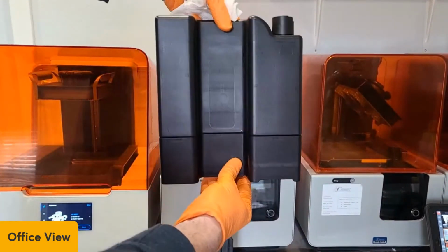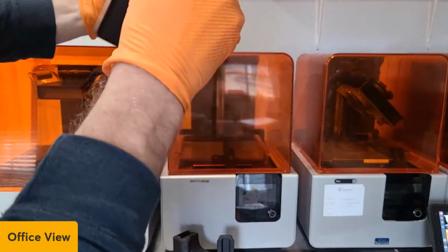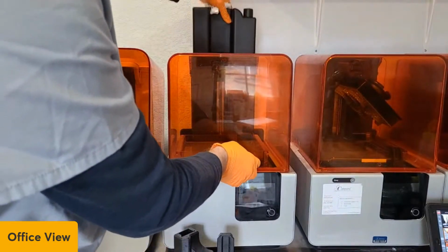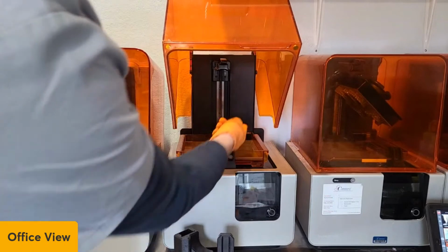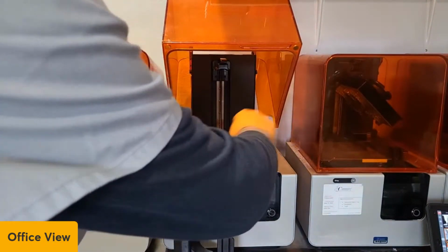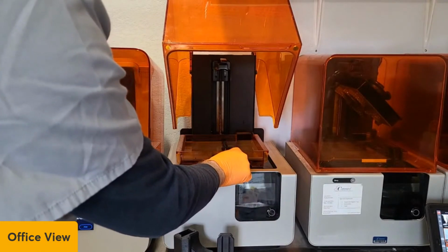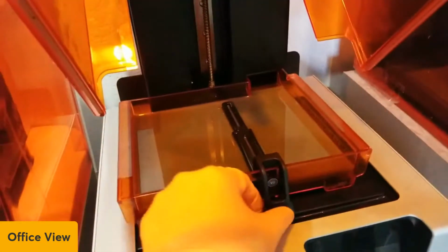So these are my draft resin cartridges, and they auto dispense. It has a sensor in there that senses the level of how much is in there, and if it needs more, it just dispenses more. So you don't have to keep adding resin or top it off or anything like that. And then this thing right here is a mixer bar. Let me change cameras. Let me get in here. So this is a mixer bar, and it just keeps it mixed.